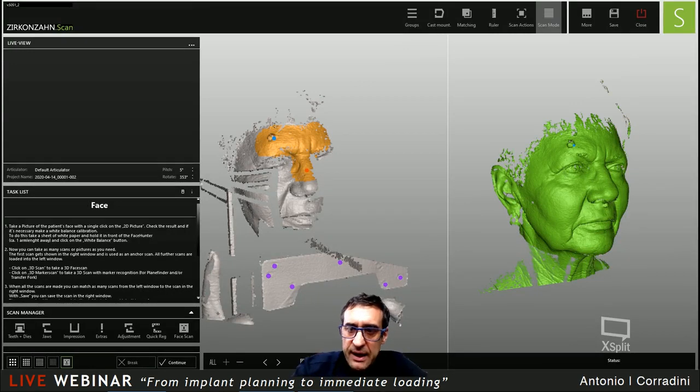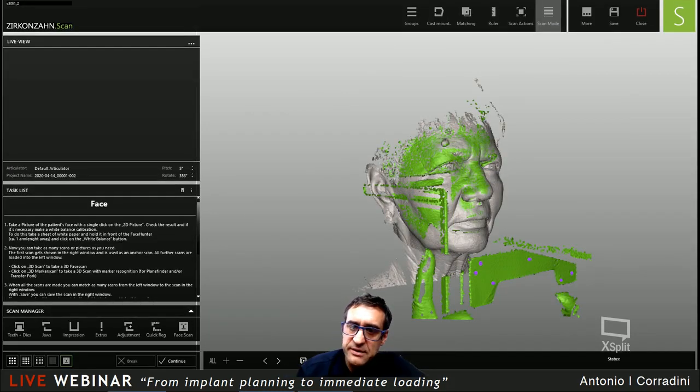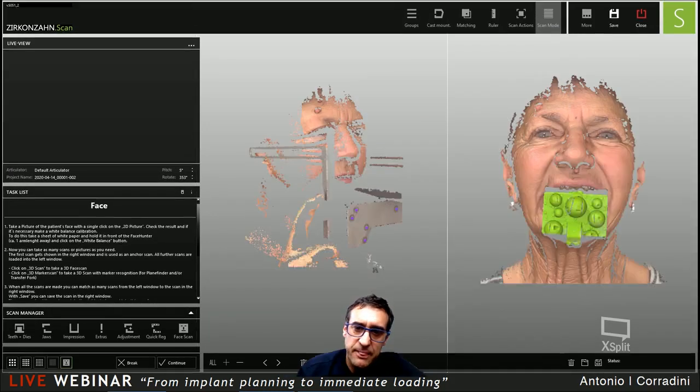Once again, we align our reference here on the right side with the following scans, like the plane finder or different phonetics that we suppose help us during the design and during our workflow. So 2 points on the left, 2 points on the right, and match together.